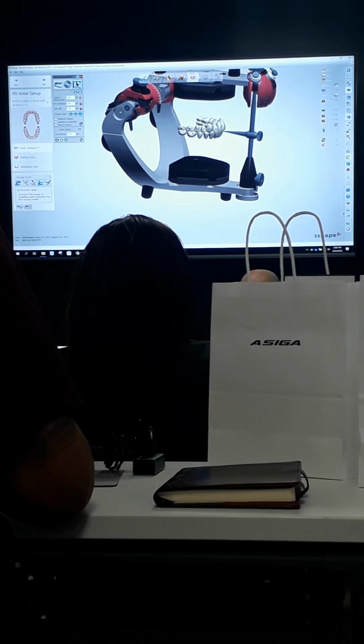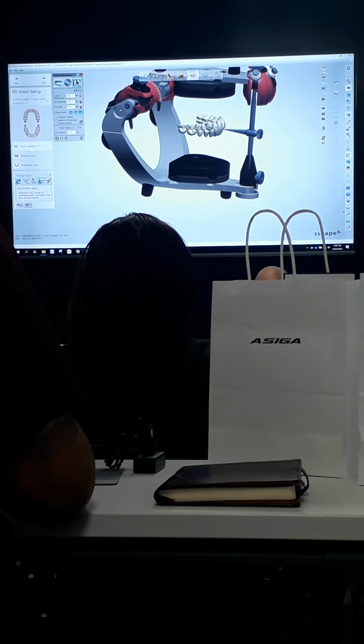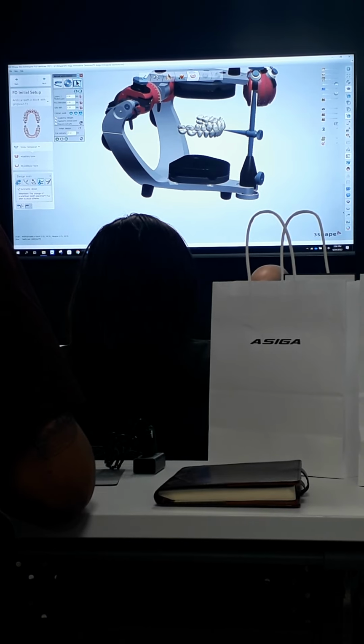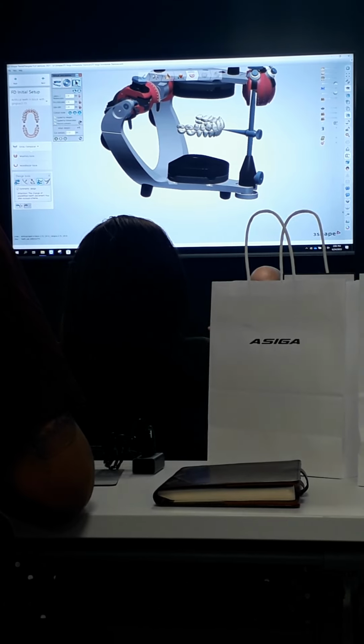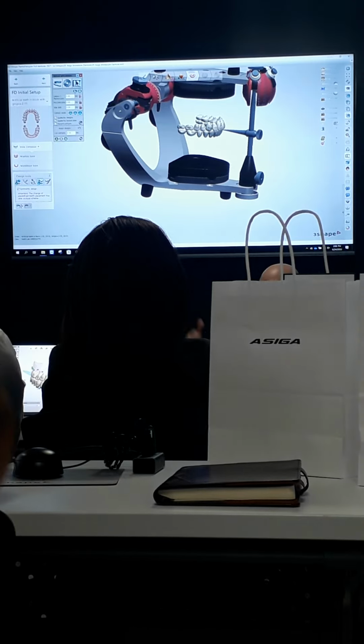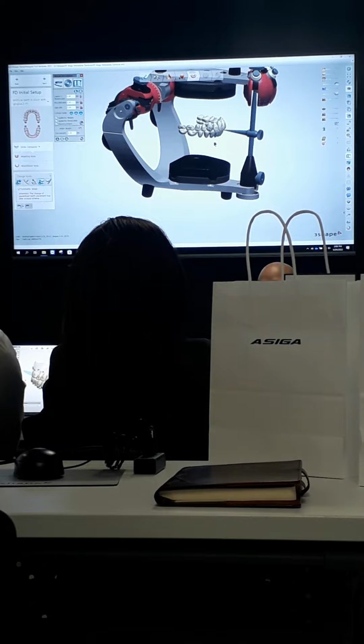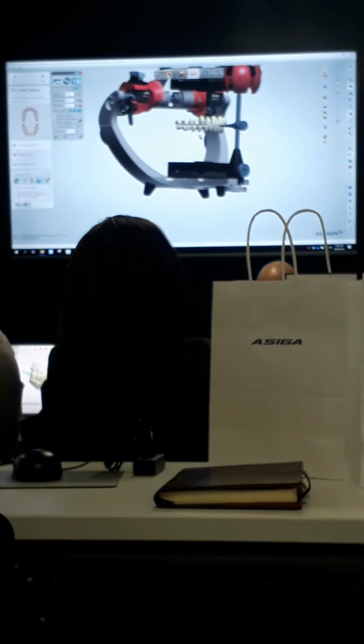Later on, when we get into the sculpt anatomy step, I'm going to show you the ways that you can actually see those contacts corrected, so you've got the bite correct together. Where those functional marks are, you can actually go through, just like if you took a physical articulator, tapped it together, ran it through function, and then adjusted the bite paper spots. Same thing. I'll show you that later on. You can't do it here. It's actually the step after you bridge things.